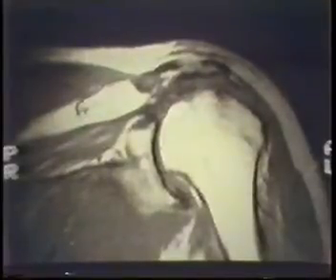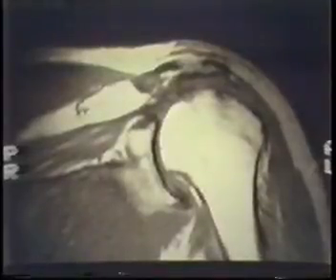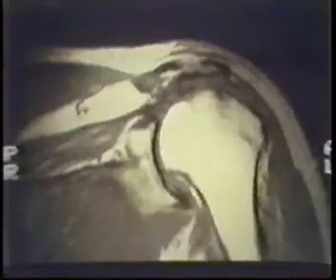I have not done that study on shoulders, and in the coronals especially it might be better to do the thin cuts. In general I prefer the little thicker cuts because, as I gave you my bias here, when we're dealing with the disease process, spatial resolution isn't all that important. You just need to be able to see that tendon, and I've been very happy with 5s.